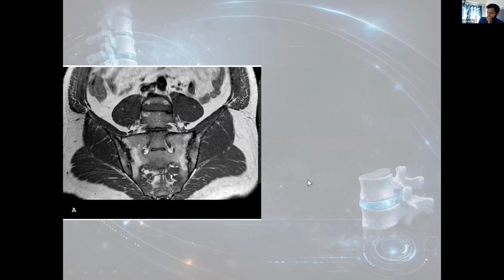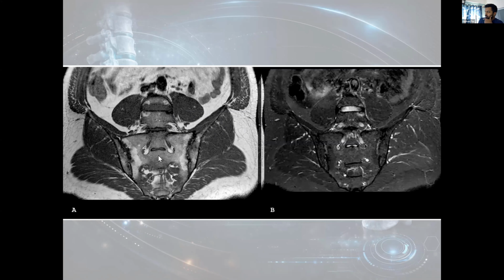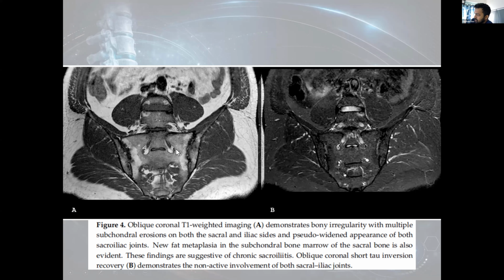Now tell me this, T1 or T2? Not STIR, definitely. Now we will see the difference. This is the STIR image where the fat is suppressed. So the white thing which you are seeing is the epidural fat. So fat has been suppressed here. So this is not fluid. This is fat. So that is T1. You can see the disc and also tell, provided that it is not degenerate.